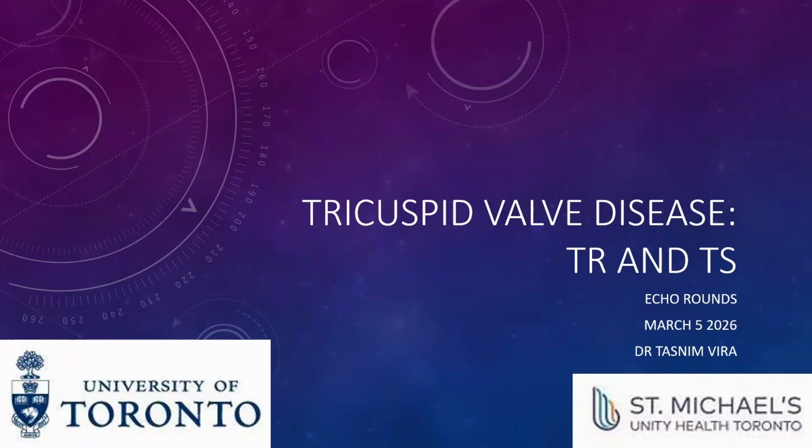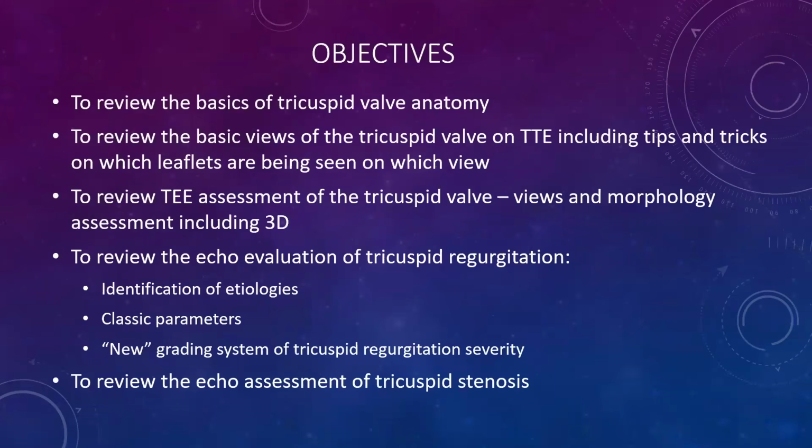And the focus will predominantly be on tricuspid valve disease in terms of looking at the anatomy, looking at the morphology of the tricuspid valve.